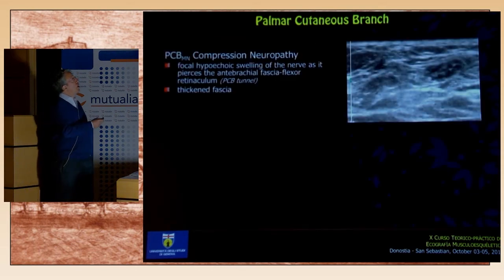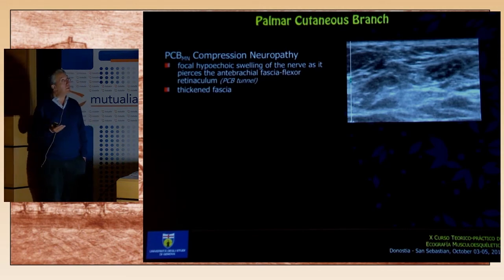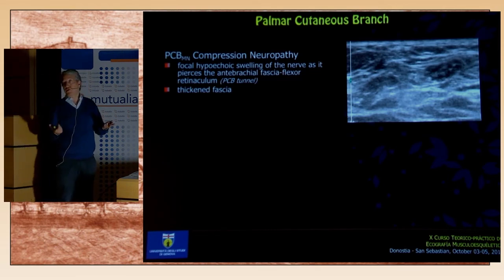Just some example of the compression neuropathy of the palmar cutaneous branch. So you know the palmar cutaneous branch may be damaged after surgery, but it may be also compressed. Where is the site of compression? When the branch pierces the fascia, of course.